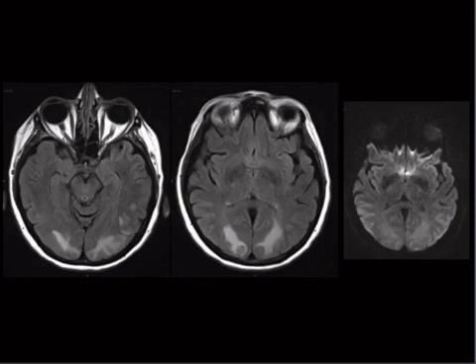So remember, this is gamesmanship. You can have things in the differential. You look at your A, B, C, D, and you say, okay, well, what restricts? A stroke restricts, right? This could be a stroke. Certain infections restrict. So things that classically restrict, you can eliminate, and then whatever's left, you could try to figure it out.